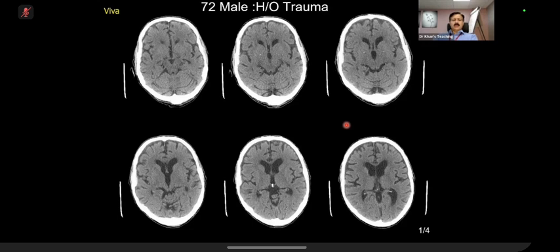Okay. History of trauma. Is there a hematoma there? There is a small subdural hematoma along the right parietal region, just at the region of the sylvian fissure. Which slice? Top row below, second row. So I can see it better in the first and middle image in the bottom row. Okay. What can you do to confirm this?